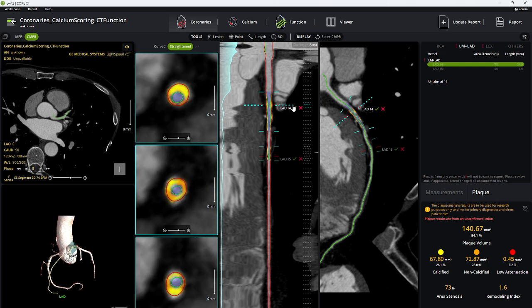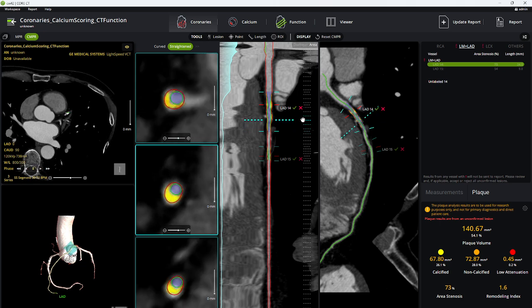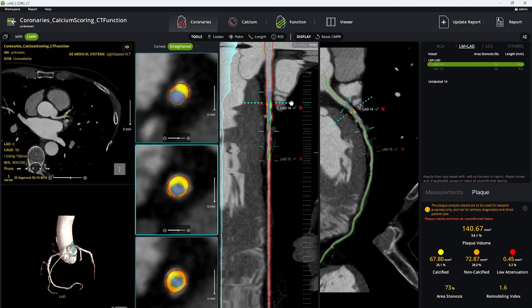and look at it. Now, when you have the navigation bar here, what you are looking at over here on the left is a layer above and a layer below of what this is. And these little dots over here on the right-hand side are the layers. So the layer above this one would be this image over here on the top, and the layer below would be this image down here on the bottom left. You can go ahead and navigate up to it.